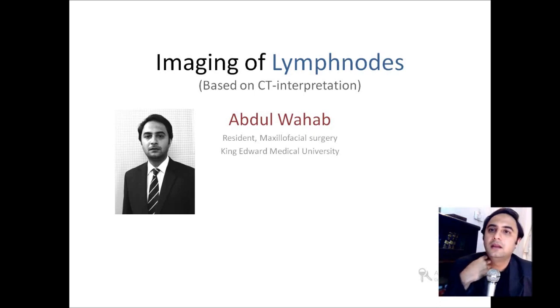Alright guys, let's start with the imaging of the lymph nodes. This short video lecture is basically based on a CT interpretation of lymph nodes. Now every resident, especially the junior ones, will always come up with one question: show me where the lymph nodes are. This question is the favorite of the maxillofacial and the ENT residents.